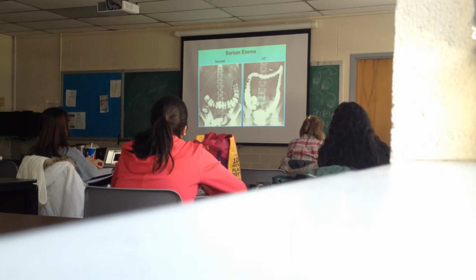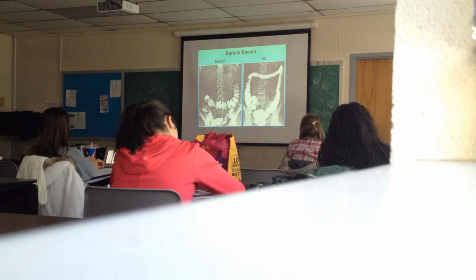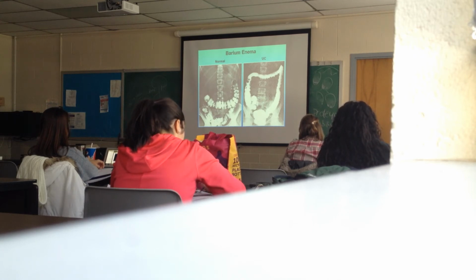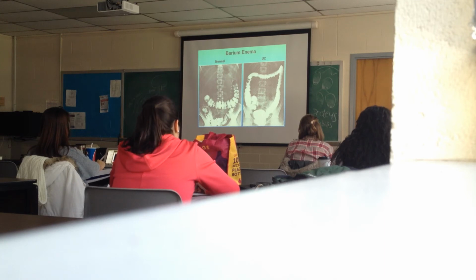Inflammatory bowel disease. This is an example of ulcerative colitis. You get lots of inflammation, which causes lots of scarring. Scar tissue contracts, takes all the slack out of the bowel, makes it really taut. So we have here, again, the ascending colon right here. We have the transverse colon right there. Instead of making a lazy turn going from the hepatic flexure to the splenic flexure, it almost goes straight across. There's just a lot of tension in this bowel. There's no slack in it at all. And it goes straight down.